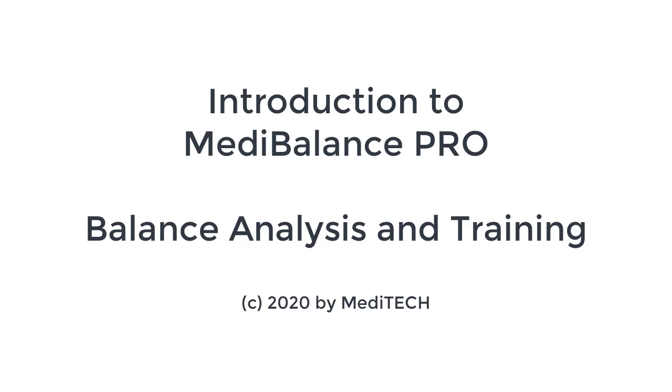This is a training session on the MediBalance PRO system. We are getting right into the topic. We start the pre-installed software by clicking on the corresponding icon for MediBalance PRO, which is the two figures in red and blue. The software automatically launches.